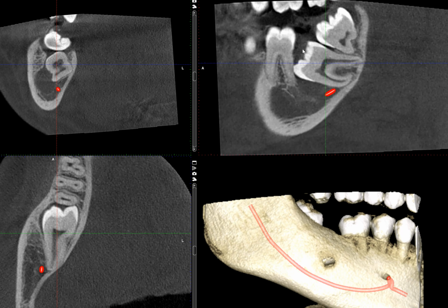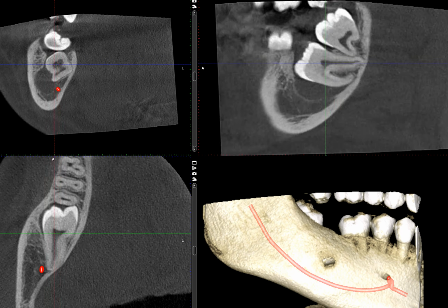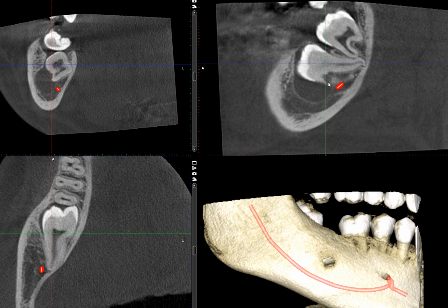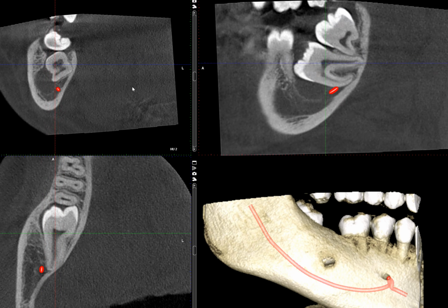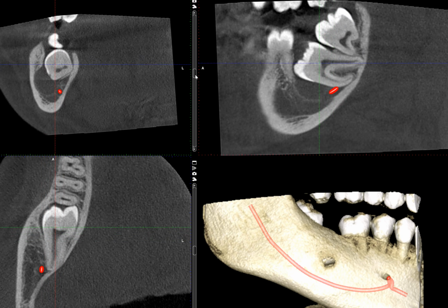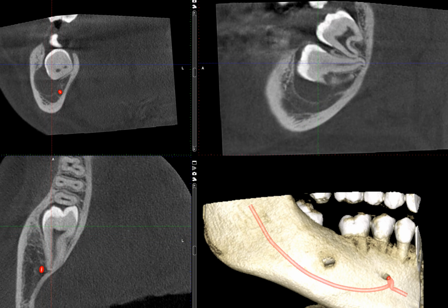Now let's recap that information from the sagittal view. It's very similar to what we saw right from the panoramic radiograph, that well-corticated pericoronal radiolucency, and there is the site of resorption. Again, the new information that we have is the buccal expansion of the lesion and the resorption, and we can certainly better visualize the relationship between the roots and the mandibular canal that runs just adjacent to it.